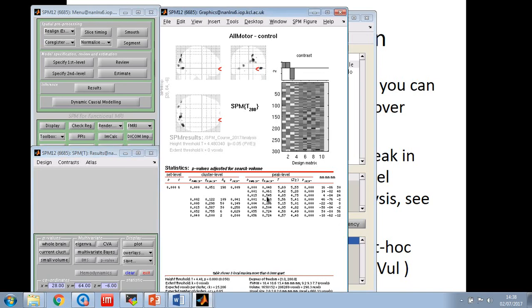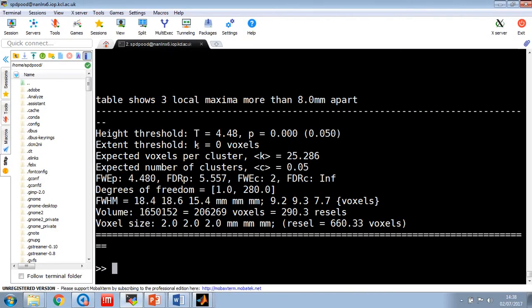You can right-click on the table here somewhere. That's being awkward. You click on these different points and it'll move to different clusters, but I'm trying to get it to, okay. Print text table, and that writes the text out here.